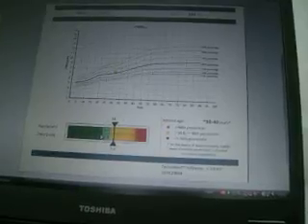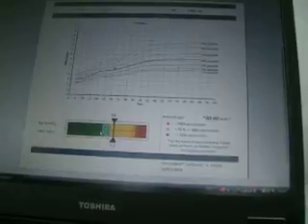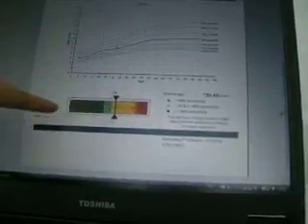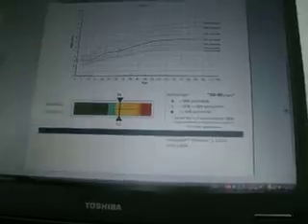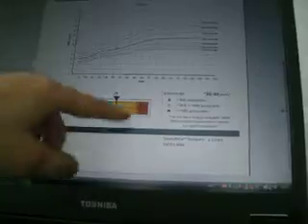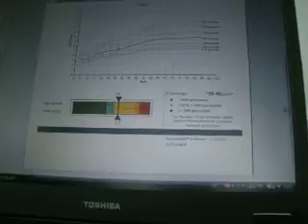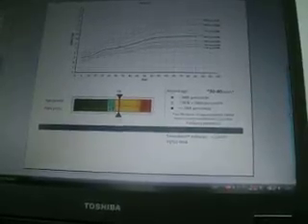real age. If there is a great difference between the two, that gives you some warning about the status of the patient. Okay, we always prefer these values to be in the green field, meaning that the arteries for the patient should be always as young or even younger than the calendar age of that patient. In the yellow line, that's just a warning, but if they are in the red field, then you can be quite sure that the patient is in a high cardiovascular risk.